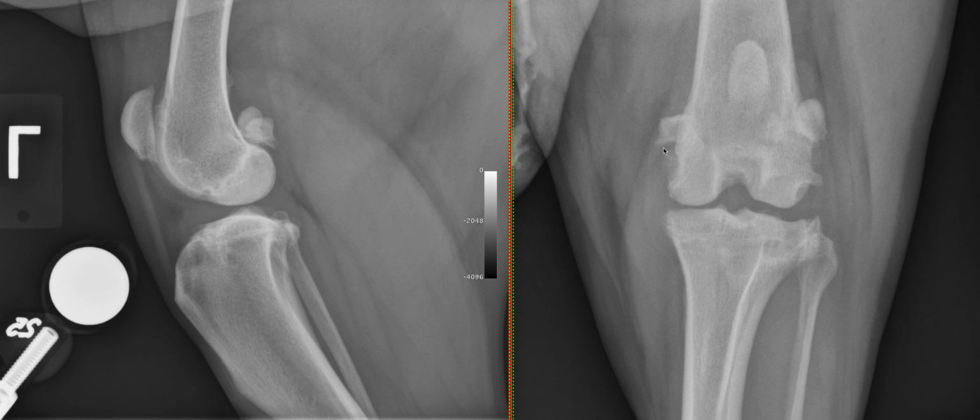So you can see here, for example, on the distal femur, proximal tibia, distal patella, proximal patella, and on the fabellae as well, like here and here on the craniocaudal projection. And we can also see some new bone production on the tibial plateau at the site of attachment of the cranial cruciate ligament. So this would indicate the presence of mild to moderate degenerative joint disease.